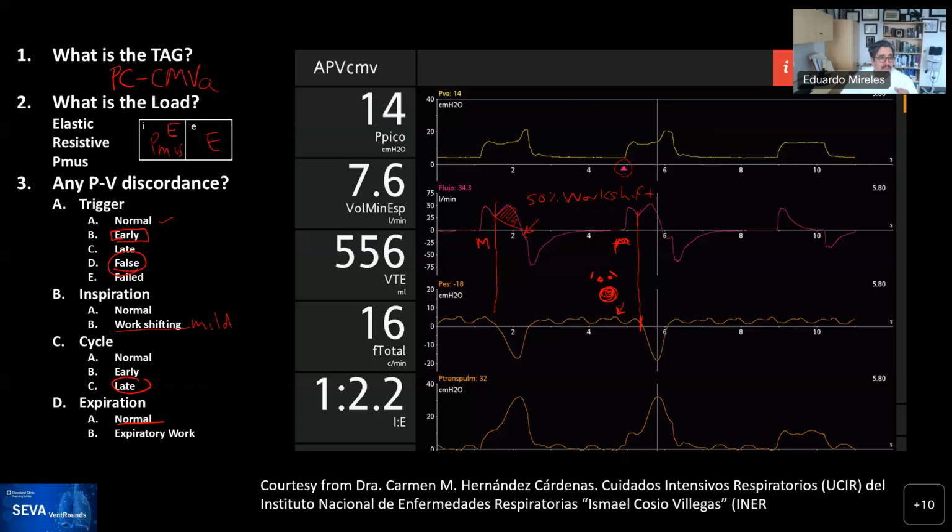then finally we talked a little bit about cycling. I see a question from Chip that says, if tidal volume on the first and second breath is roughly double the third, but this is adaptive pressure control, why didn't the pressure drop on the third inspiration? Great question. It all depends, and Rob, please correct me here. It all depends on the algorithm that they have for the ventilator, for adaptive. Not all ventilators behave the same way.